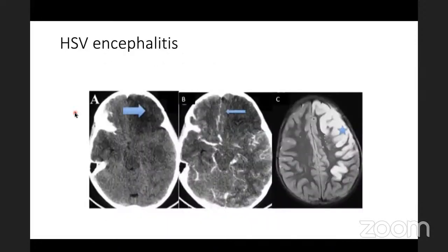So coming to viral infections from bacterial infections, you know that the most eminently treatable, and probably the only treatable, viral infection is HSV encephalitis. So you should know how herpes looks on the CT scan. Whenever you have a hypodensity, I told you it could be edema or an infarct. These are the two important differential diagnoses. And if it follows a vascular territory, which I'll show you later in the section on vascular problems recognized on CT, you call it an infarct. If it doesn't follow a vascular territory, this is simply edema, right?